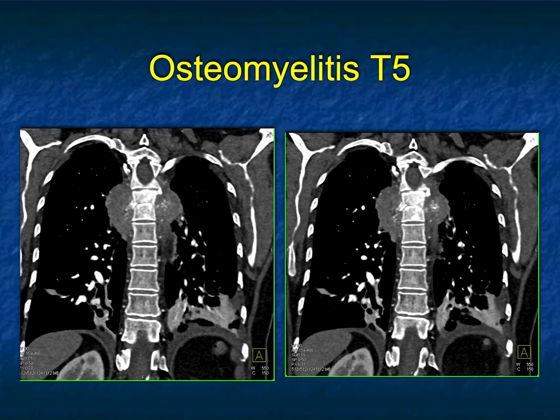Osteomyelitis. Osteo can present with severe back pain and can present as a dissection. Again, if you had a chest x-ray, you might see a widened mediastinum, again, suspecting a dissection or even adenopathy. A very nice case of osteomyelitis at T5, and with this gibbous deformity, it was due to tuberculosis.